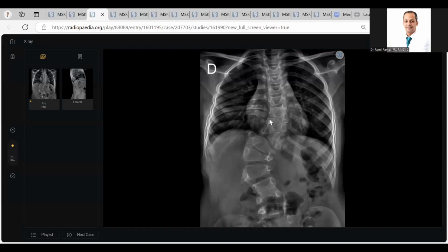It is measured usually by a Cobb's angle. What is the value? Tell me. I don't remember the value. Could you enumerate the different anomalies which you have seen here? There is a wedge-shaped deformity, and I think there are hemivertebral bodies as well.